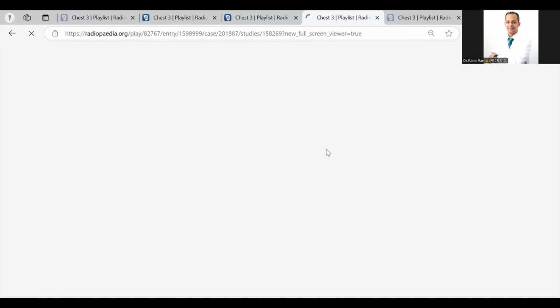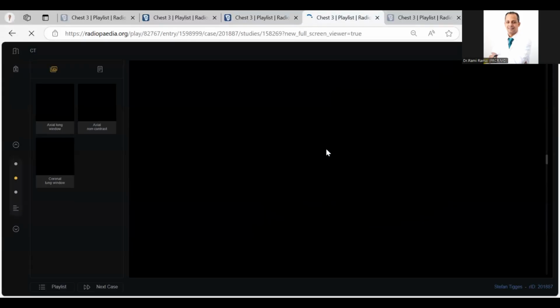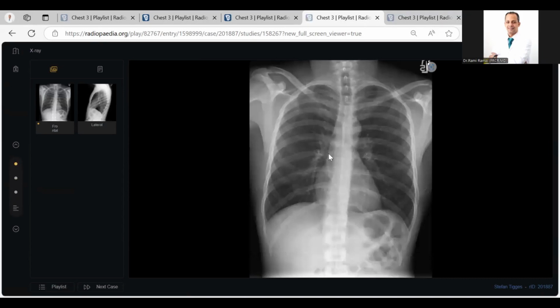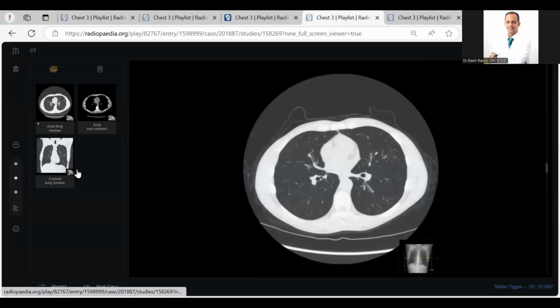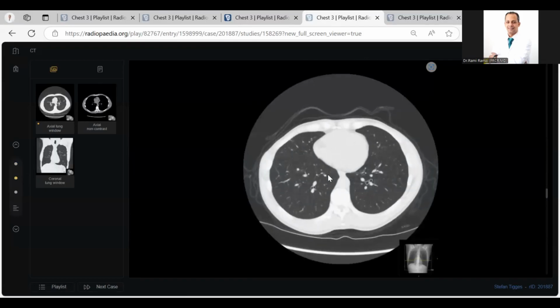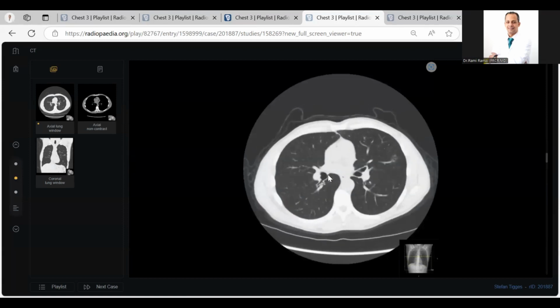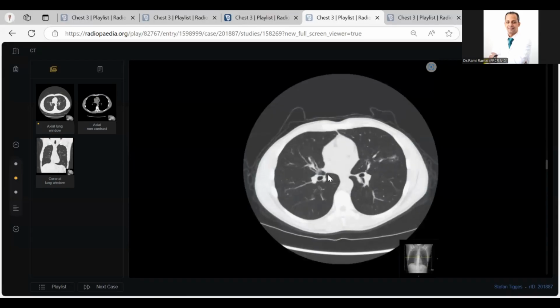Okay. Second case, you were delayed and confused. First, you started very well. This is an X-ray of a patient who has a persistent complaint for 1 month. You did very well when you told me this is persistent, chronic, you should do a CT. Very good. We came here, you picked up some opacity. Okay, this is ground glass opacity, not just opacity.